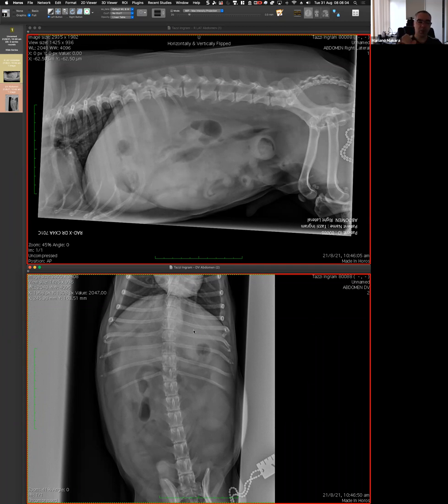So after a while, the description in a radiograph turns out to be almost like a boring thing because it's almost using the same words. One day I'm going to share, there is a book about how to write reports in radiology, and they insist about being boring because the important thing is to communicate what is abnormal, not to be very, very colorful in your descriptions or whatever. So it's almost always the same. Obviously, the radiographs are different, and what we are looking at is different, but how we approach it is always the same. Okay, so what do you see?